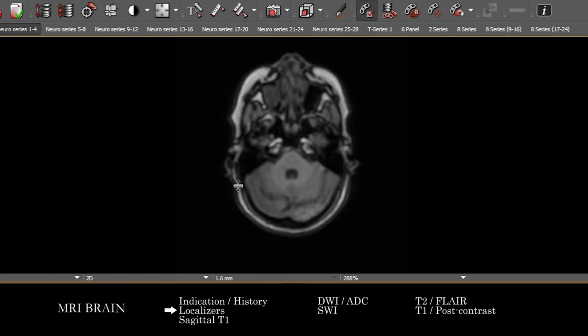And so that basically covers the approach to the MRI brain, pre and post contrast. Major things to think about are just to make sure that if you have found abnormality or have not found abnormality, to see if that's concordant with the provided indication and patient history, and particularly for any sort of known abnormality on prior studies. And anything you find in any one sequence, it's very important to correlate across the various sequences to see what its signal characteristics are like across the different MRI sequences, and that will help you come to a more fine distinction as to what pathology you're looking at.